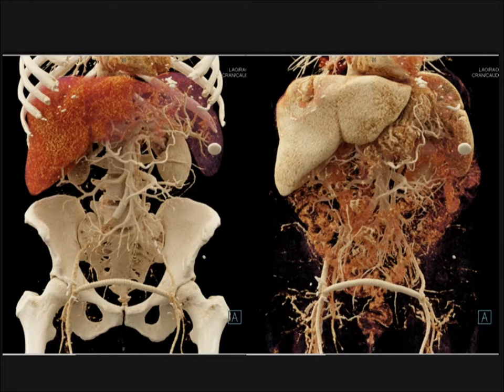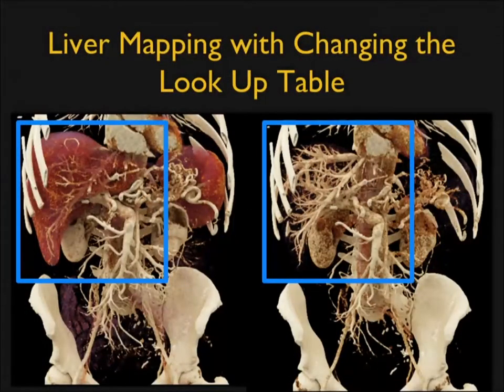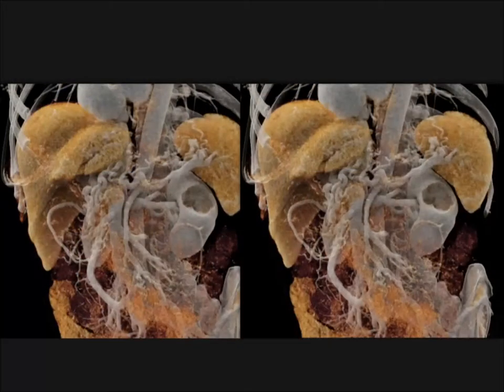It also makes the point that it's very easy to hide things. On this, I'm showing you the surface of the liver, and then I'm showing you inside the liver. So you need to show everything. The key is, how do you create these vascular maps that show everything? That's a challenge, and I think something at some point that AI can do. Or in this case, where you see some of the collateral vessels, you see very nicely the increased folds and flow in the stomach. You see the collaterals and the transparency with this rendering and this rendering.